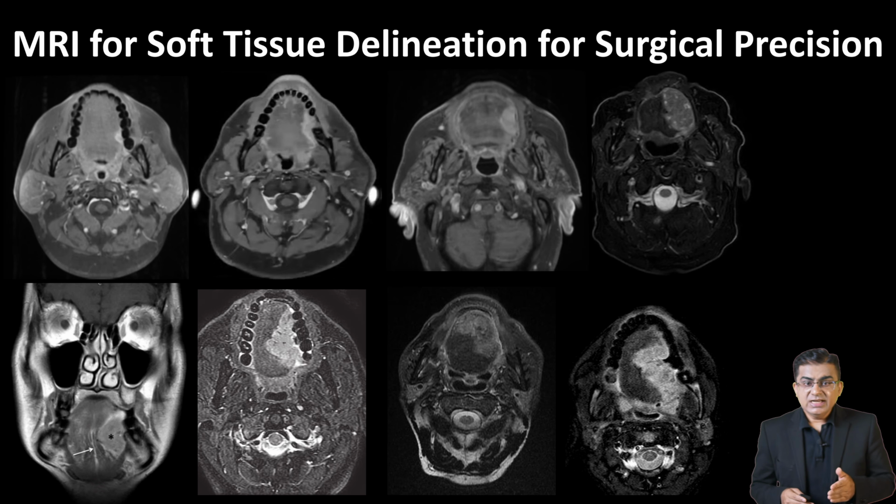You can also check the lingual neurovascular bundle to see if they are displaced or invaded. Finally, we can accurately trace how far back the tumor has gone. We can see its exact relationship to the base of tongue, vallecula and the hyoid bone. You need this exact mapping of primary tumor in tongue for accurate staging, surgical planning and radiotherapy planning. This level of detail is simply not possible with a CT scan.